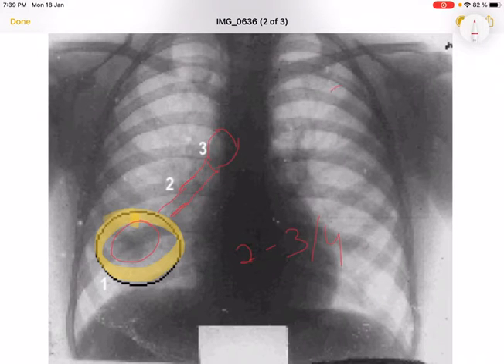Why? Because in the pneumonic phase the disease was in a progressive or active form. Now it starts to resolve by body immunity or because of medications. The same thing happened with the lymphangitis and the lymph node as well. In the early pneumonic stage the size was big, now it became small. So the disease is not progressing; rather, it is in the resolving phase.